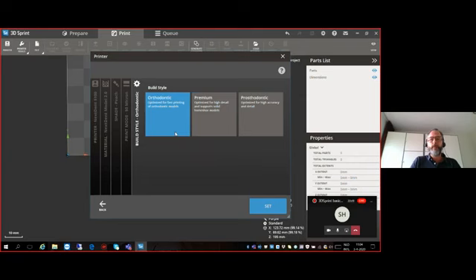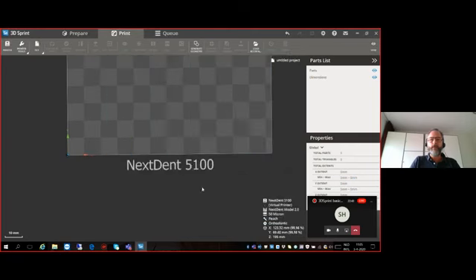We have three different build styles. Orthodontic, optimized for fast printing of orthodontic models. The prosthodontic, on the right, optimized for high accuracy and detail. And we added one, I think about a month ago, the premium build style, which is optimized for higher detail, and also supports solid horseshoe models. For the first thing we are going to show you in this webinar, I'm going to select orthodontic. And once we have selected everything, we click the set button.